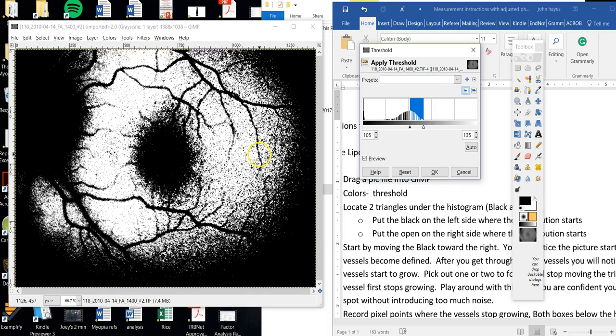This is probably not too bad. So we've found the point where we've got the most light with the least amount of further growth in the vessels, and we've minimized the dark black splotchy things. It's pretty subjective, but really not too bad.